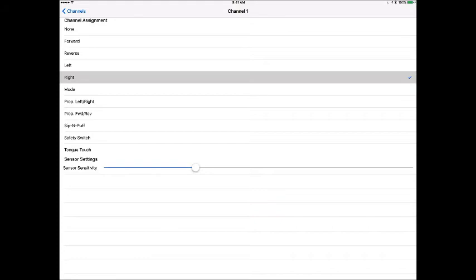When the person activates the stop switch, meaning that the straw is pulled away from them, a signal will be sent to the chair to stop the chair, because they could be running in latch mode, and even though they have their seconds in latch mode set, there are some sip and puff users that don't use the time stop on the latch mode. So again, there are different features, different things that you could use the safety switch with.